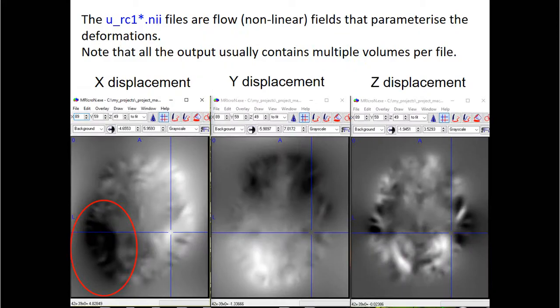And this is what is encoded in this X image. You displace it from left to right, and it is black. So if it is from right to left, it is white. And the same for Y displacement, and the same for Z displacement. And this is what is going to be used for normalization first, and second for modulation.